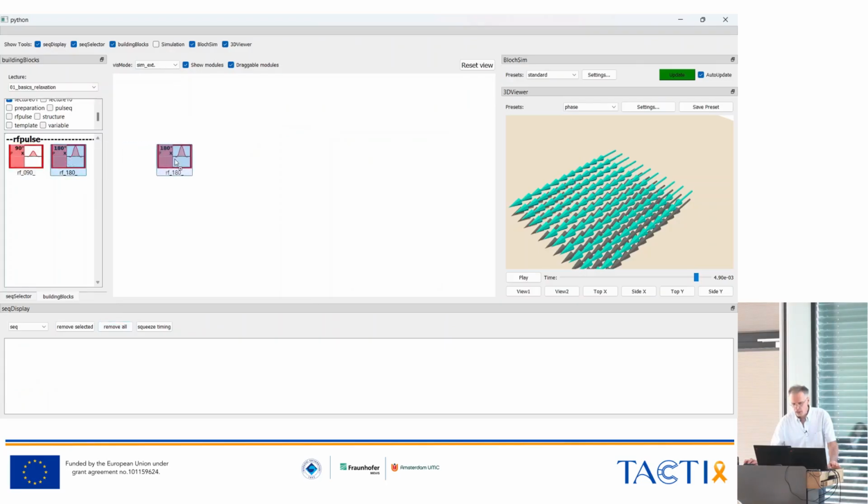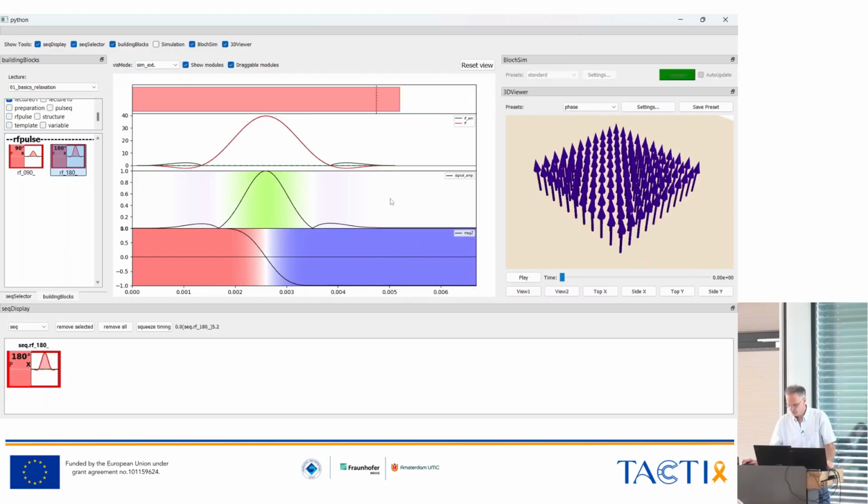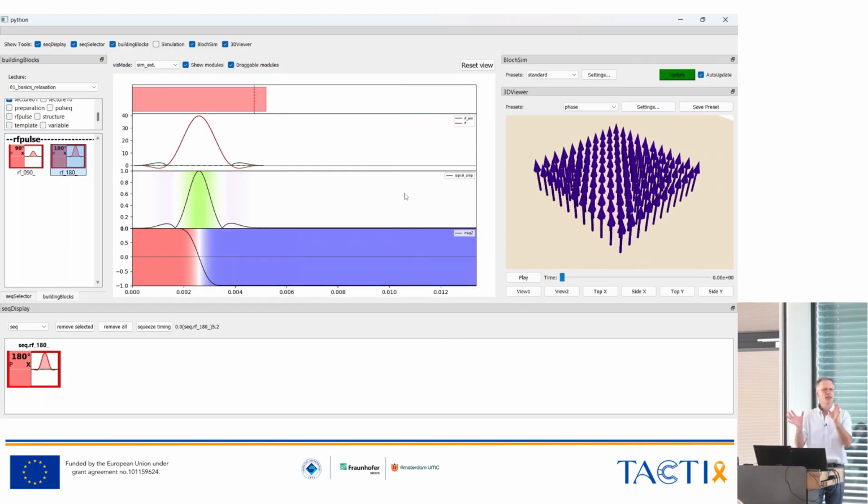So if you want to, you can also have the inversion recovery part. I think that's something you can play around with this afternoon. There we will have a 2-hour slot where you can test different things with the tool and also solve some exercises if you are interested. So yeah, I think that's the simplest part, just looking at your relaxation part.